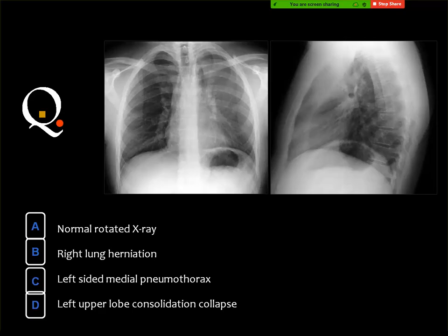Actually this is somewhat difficult, but if you see the lesions in the plain X-ray, you should favor the possibility of contusion more than the COVID opacities, because the COVID opacities are at the level of ground glass, and they are not clearly seen in the chest X-ray. Also, if you can see fractures of the ribs, this is in favor of contusion.